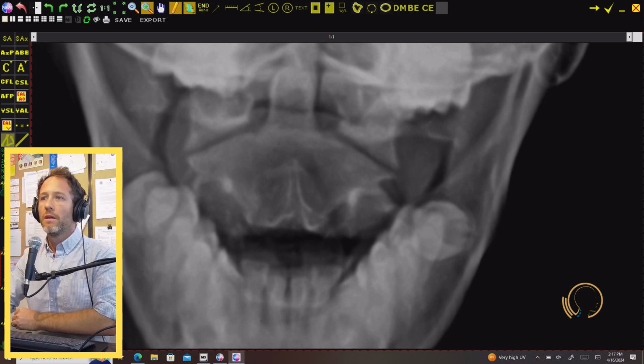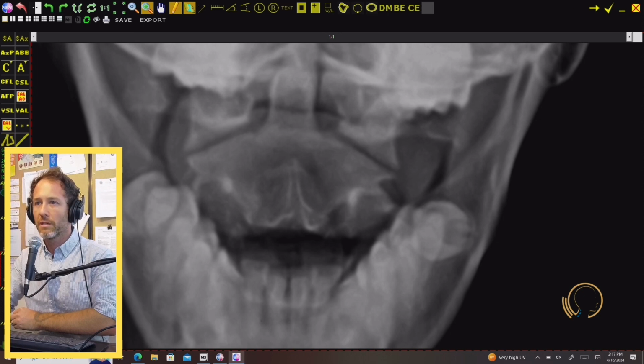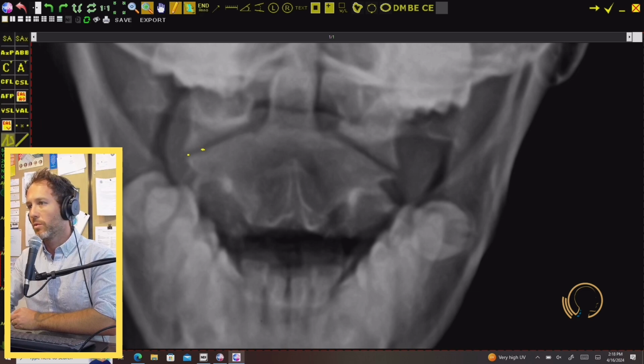But you start that axial circle measurement with icing on the cake, frosting on the cake. That's what Dr. Pierce would say. But you're going to find that lateral margin of the superior surface. I'm just doing these with the freehand tool. And then about a 1/4 inch medial from that. I don't know where that dot went. Hang tight. We'll stretch it out a little bit. But just kissing the surface, like they say, frosting on the cake. Because this is going to be what you run your axial circle tool through.